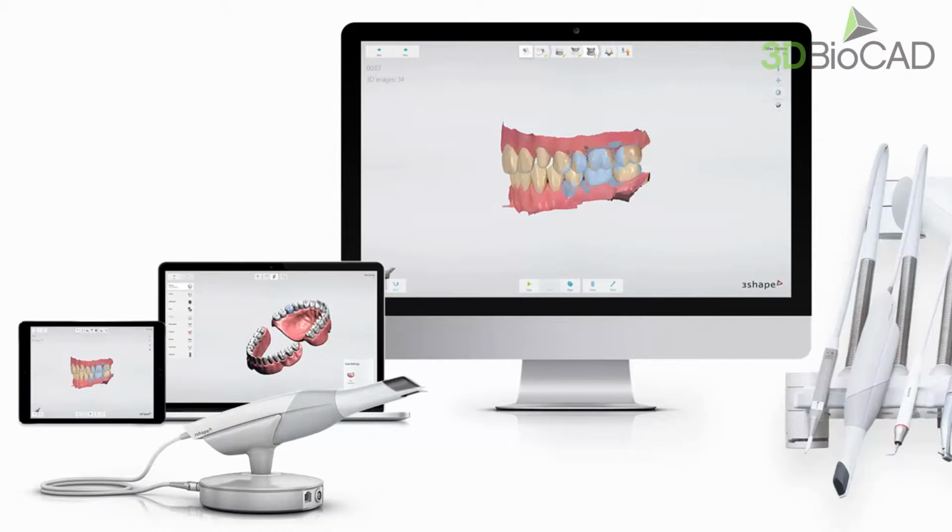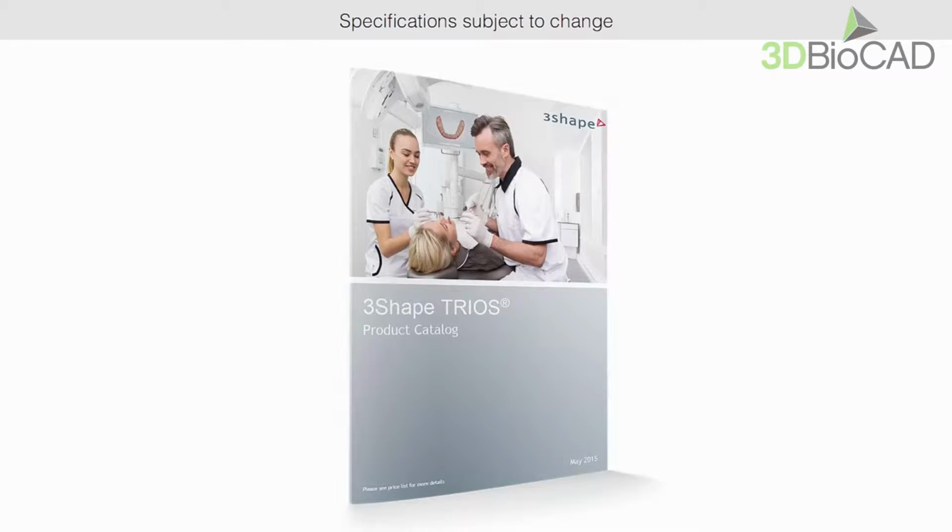In addition, all TRIOS Pod and chair integration systems should always be delivered fully functional, with the latest official TRIOS software pre-installed from 3Shape or its partners. Please find the list of approved and recommended computers for TRIOS in the latest edition of the TRIOS product catalog. The user experience when using TRIOS to a great extent depends on the processing power of the PC employed. The higher the PC performance, the better the user experience.